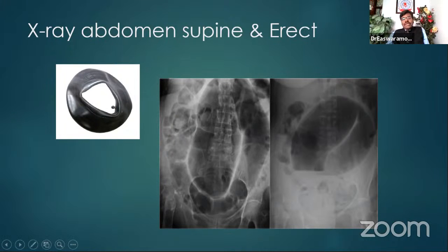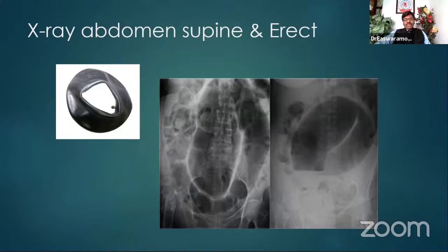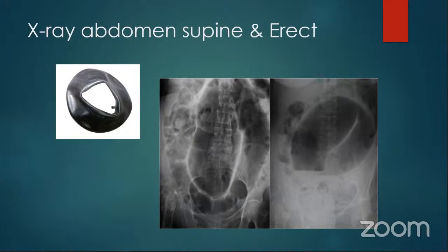Karshini, would you like to try this particular finding and the particular sign? We have said several times in the past also. If you want to see and tell, you can unmute. Sir, sigmoid volvulus. Good. That is the diagnosis. That is what the sign is called, named after. Coffee bean sign. Good. Bent tire sign. Yes. And one more sign, if you know that, makes it 90% you got it. Omega sign.